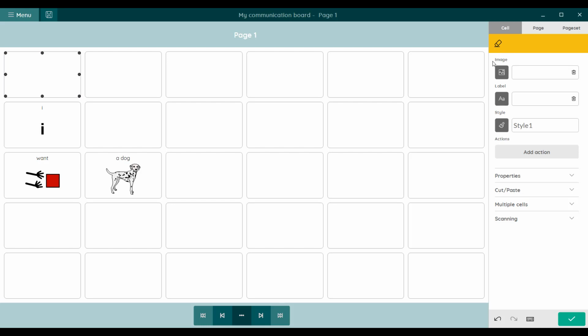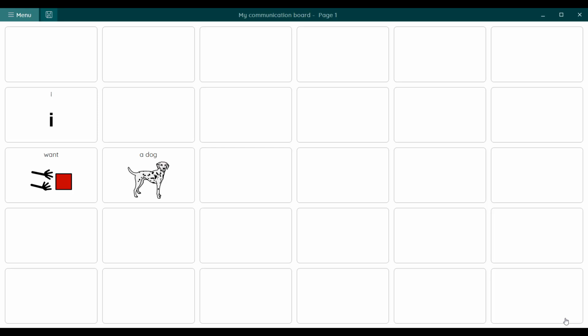Once you have finished editing, press the F2 key or click on the green check mark. You will now exit out of editing mode. There you go. You have now seen the first part of editing in MindExpress 5 and can fill in an empty cell or edit an existing one.